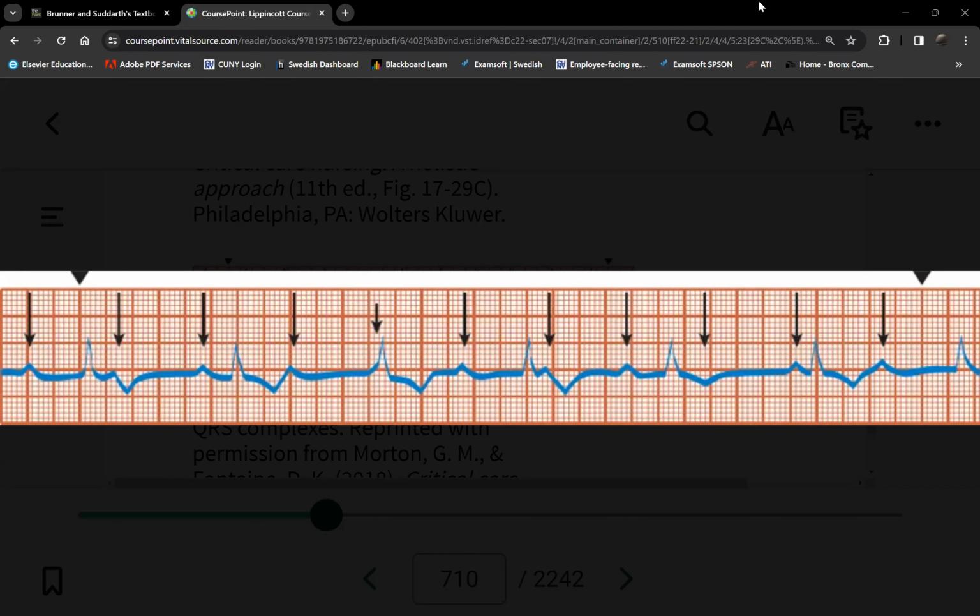So therefore, what can you say about mine and Miss Figueroa's relationship here? Are we talking to each other? No more. Since you can see the P waves are occurring regularly here and here, is the SA node firing? Yes, but is the AV node receiving each one? Not at all.